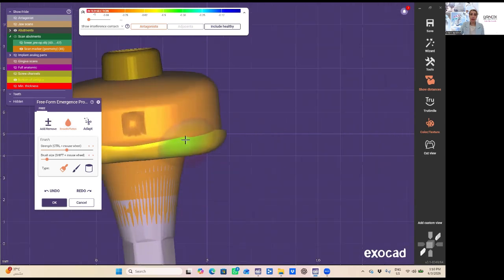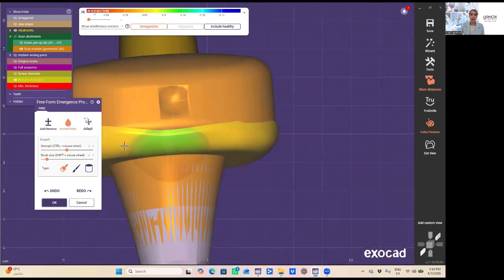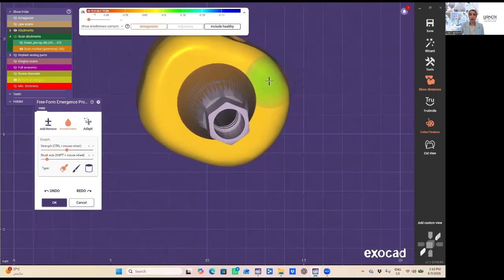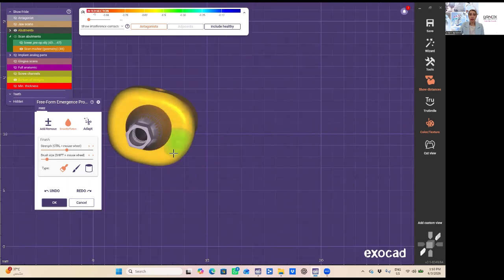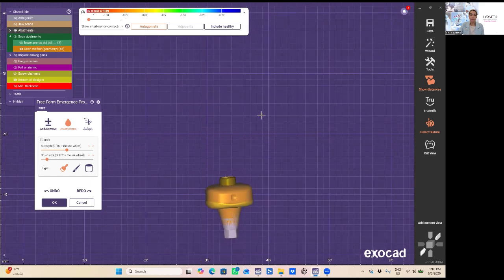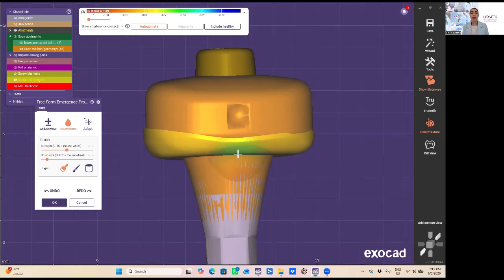As we can see here, we are exactly following the base of the iPhysio while designing the crown base. And the good thing here is that the soft tissue in the patient's mouth is already conditioned to receive this profile without any pressure from the soft tissue on the crown base.